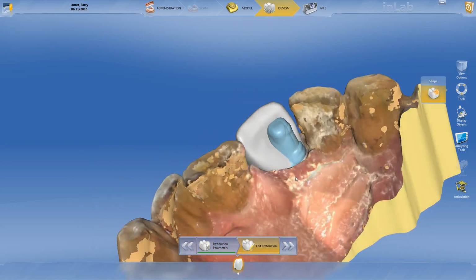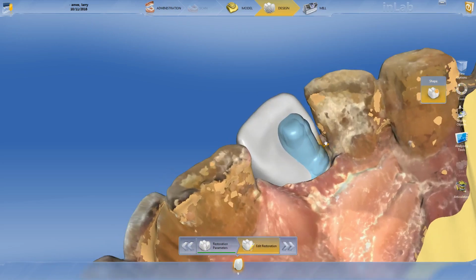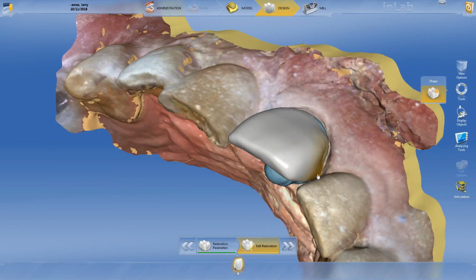This is tooth number 9. You're going to leave it there, and then you're going to turn it to the lingual, go to circular, two-directional, and then when you bring this contact over, make sure this isn't big, because if it is big, it's going to bring this side over as well.